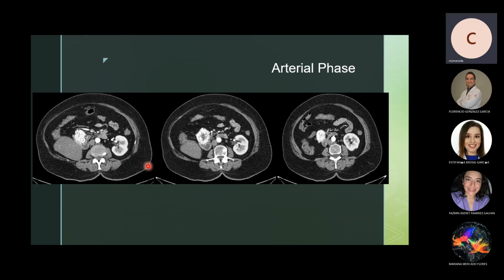In the same case, now we have three images of a tomography in axial section, arterial phase.